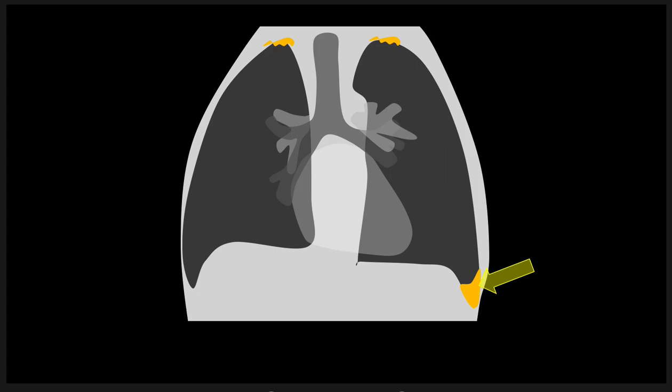I mentioned before this can mimic a pleural effusion, tiny one. It will look exactly like it. The distinction is that it's going to be chronic over multiple priors. It's going to be unchanged, look exactly the same. And if you really needed to, we could do that decubitus view that we discussed before, and this would stick. It wouldn't layer out because it's scar, not fluid.